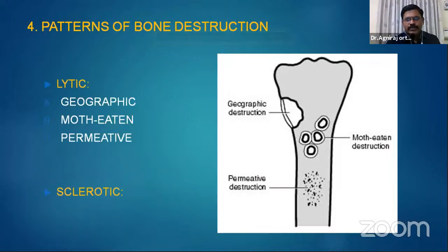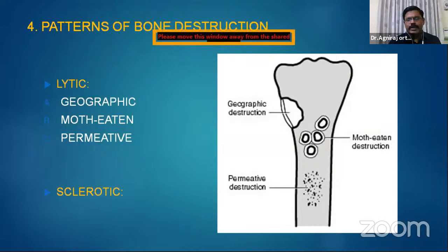Okay. We have finished three things, still four more things. Coming to the patterns of bone destruction. So I told you what the tumor is doing to the bone. It can cause lysis.